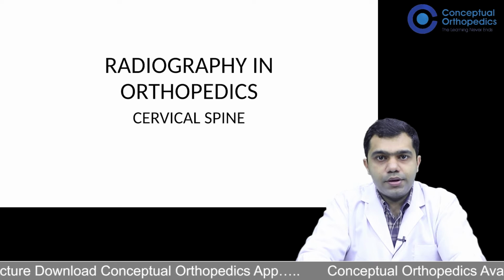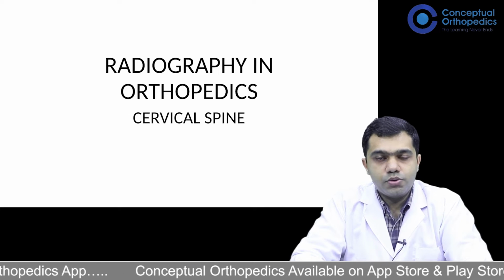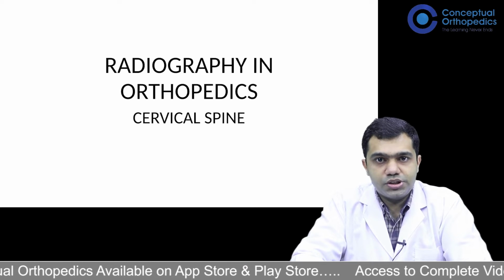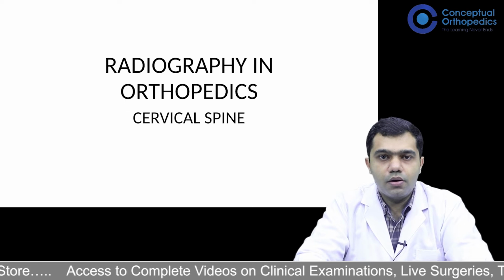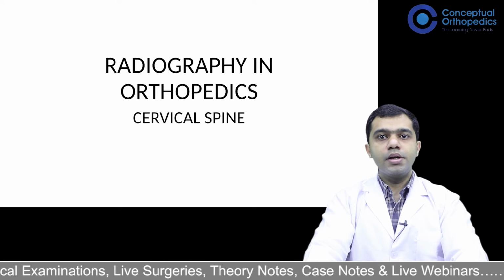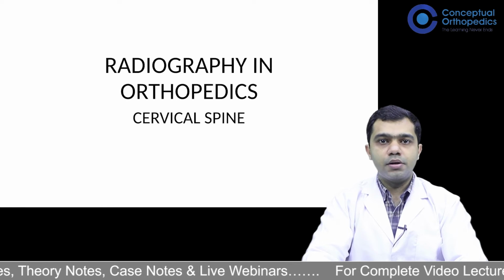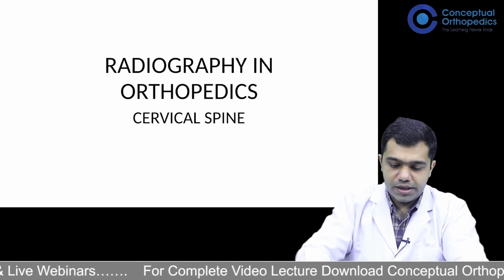So what is the particular point that you should be aware of while ordering a lateral X-ray of the cervical spine? If the lateral X-ray of the cervical spine is done with the shoulder in a shrugged position, the shoulder can come in the way while taking the lateral X-ray. To avoid that, you can specifically mention in your order that a shoulder pull down view should be done. Once the shoulder is pulled down, the neck is quite visible, so that even up to the T1 vertebra it will be visible. So that shoulder pull down view is important while taking a lateral X-ray of the cervical spine.